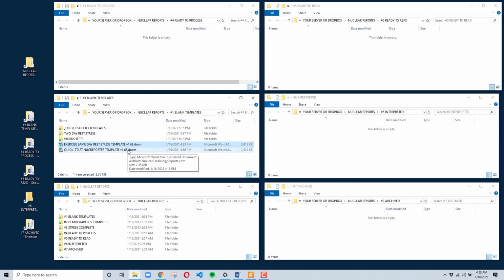So I went back and just made a full application out of Word documents, which I think you'll see works pretty nicely. It's been refined continually since I started in 2010. And I'd say it's pretty much perfect now. There are no errors in there. There's full error checking, et cetera, et cetera.